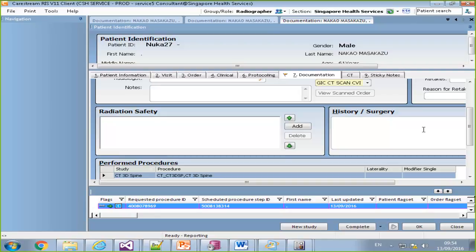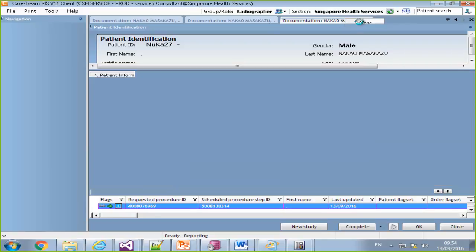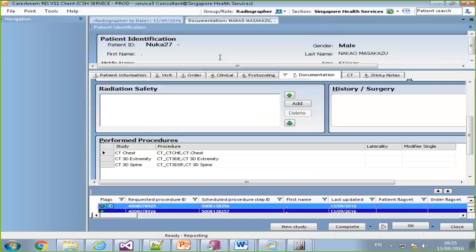This is why you saw the screen being reloaded when we clicked. There is some mechanism around it. We're still trying to find out what is the best way to show the user this scenario. So that's it about the new study. It's a lot more complex than the old one.